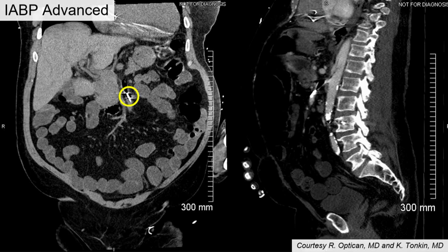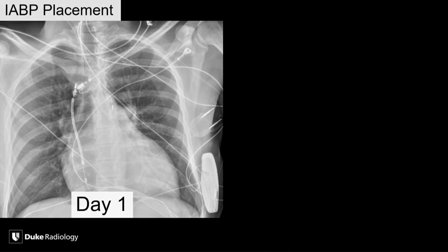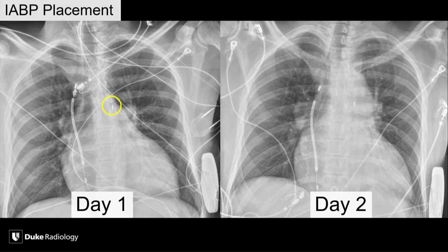Now I'm going to skip through to this case. So this patient had a femoral balloon placed on day one. There's the marker. Looks like it's in a decent position right there. Okay. This is the next day. They were having chest pain.